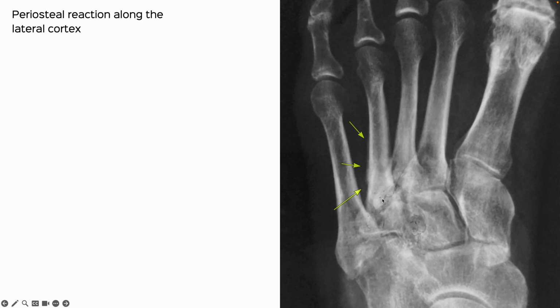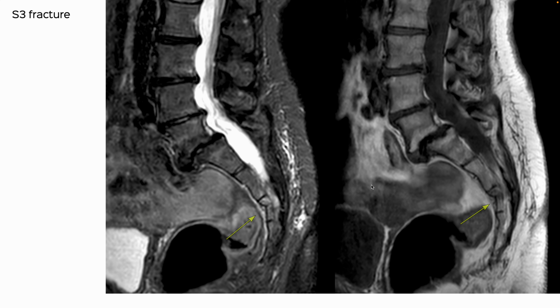So, that's straightforward. If you look at the x-ray, it's actually there. You have periosteal reaction, you have this little bit of callus formation. I think the trauma was about 10 or 12 days prior, so that makes sense. This is an artifact, but this is clearly there, and this should have been picked up. I mean, there's no real reason why not.